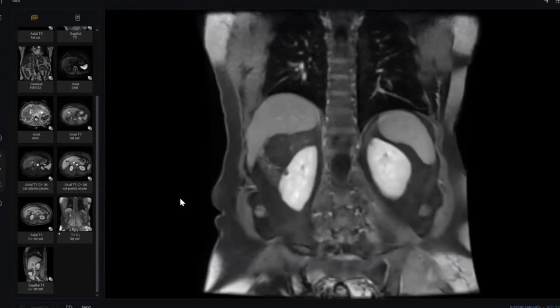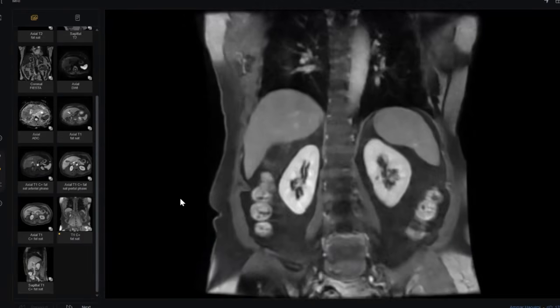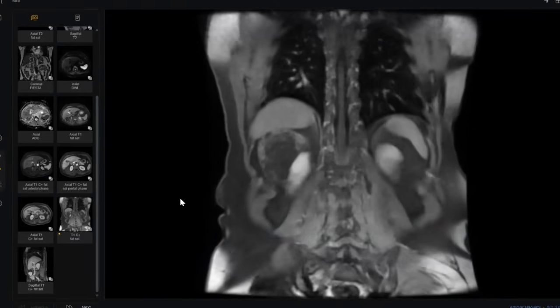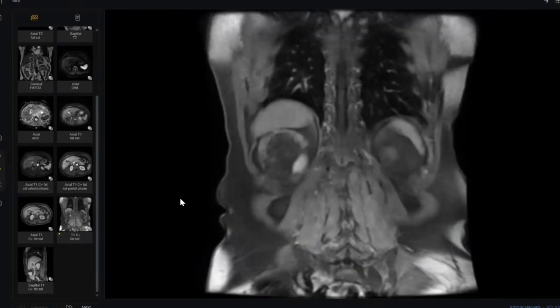Sir, it is giving a slight nipple-like protrusion within the kidney. And I think I read it somewhere that it is a sign of angiomyolipoma, that it gives a slight indentation or slight protrusion into the renal parenchyma. What's your differential diagnosis of a perinephric fat-containing lesion?